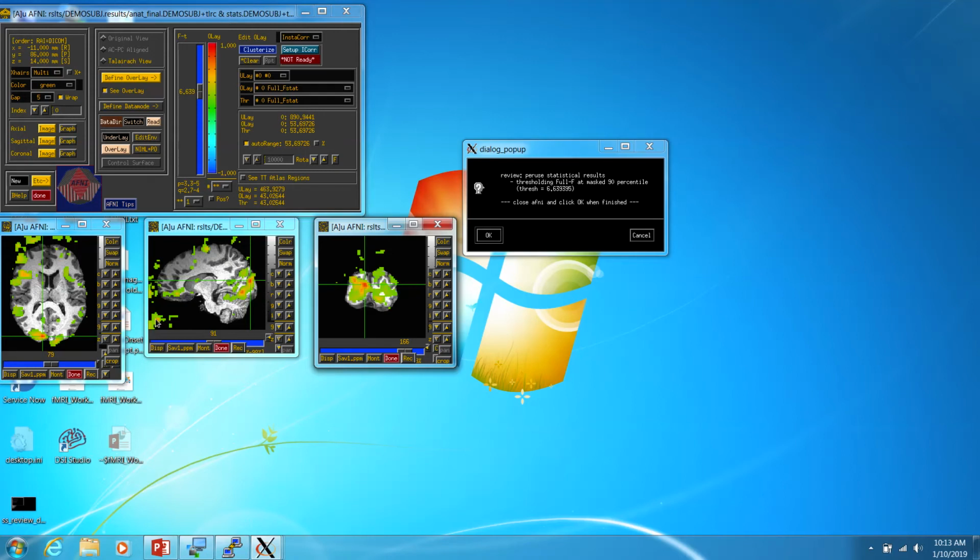If it's out here, and this was your peak activation, it's okay at this stage to have some random activation outside the brain. That gets accounted for in our thresholding later, because this is just activation related to anything in the task. But what you really want is this peak and hopefully a few other similarly dark red peaks in your image to be in your brain. That means your task has activation in the brain. There are lots of different models you can try with your data, but if you don't have activation that occurs in the brain, you don't have any results.